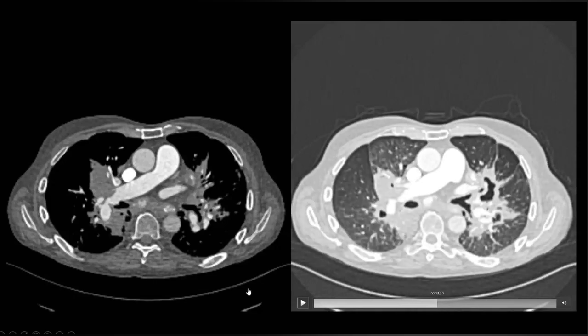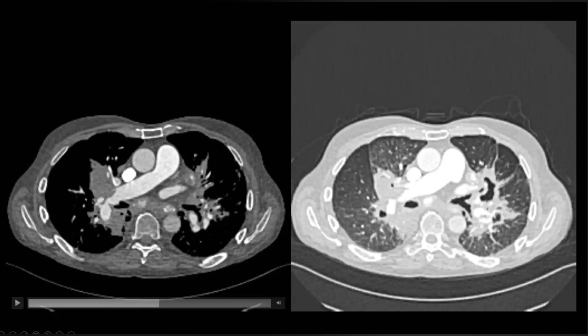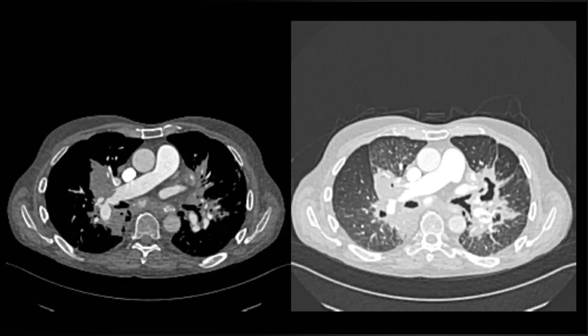On the right side, sir, it is causing encasement. These are bilateral branching perihilar consolidative and fibrotic opacities, fibrotic consolidations, with kind of reduced lung volume. Look at the lucency of the lung over here. It's quite reduced. Sir, it could be a case of fibrosing mediastinitis.